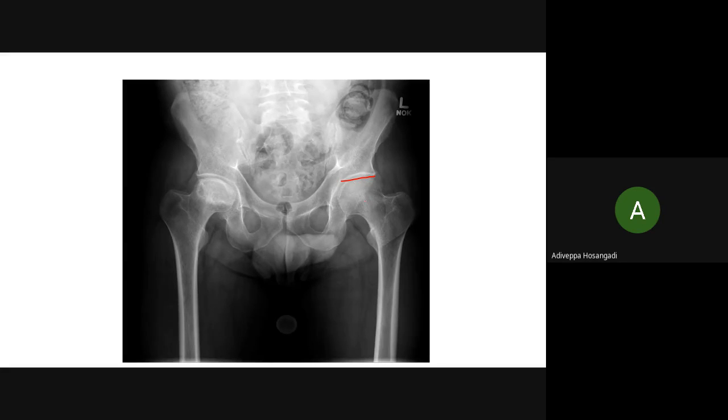Look at this. These are the fine trabeculae you can see. Primary compressile, primary which starts with the head. Secondary starts with the trochanter. So both have compressile and tensile trabeculae, tensile group. Trochanter is secondary, compressile and tensile group. We will not go there, but still I just wanted you to recollect. See, everything is fine till here.